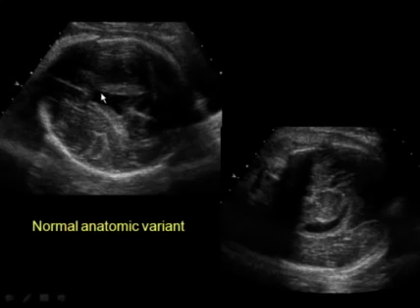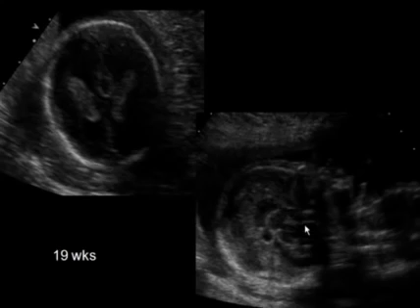The cavum vergae is a posterior extension of the cavum septum pellucidum. It's seen in the midline, between the lateral ventricles, and it can be seen here underneath the corpus callosum on the sagittal view. When the cavum vergae extends posteriorly, it's termed the cavum velum interpositum, and here we see it earlier on in the midline at 19 weeks, and on the sagittal image at the posterior aspect of the corpus callosum, a little tiny cavum velum interpositum, a normal variant. It does not need to be even included in the ultrasound report.